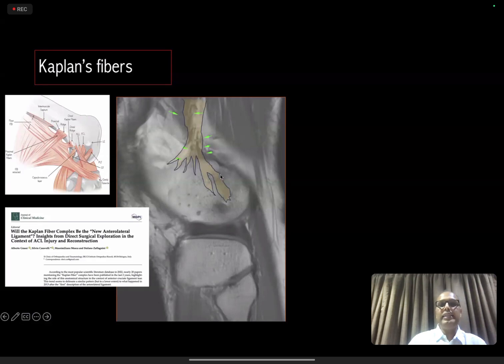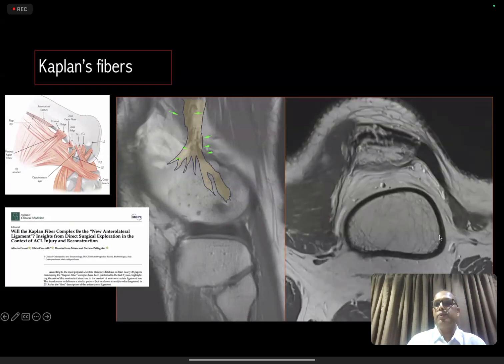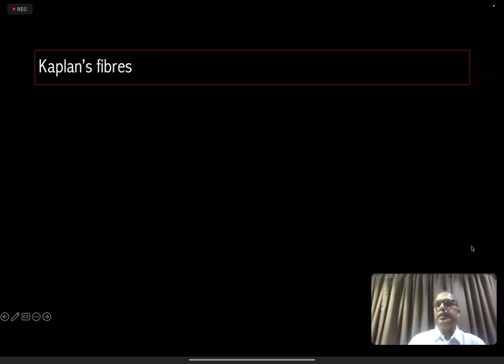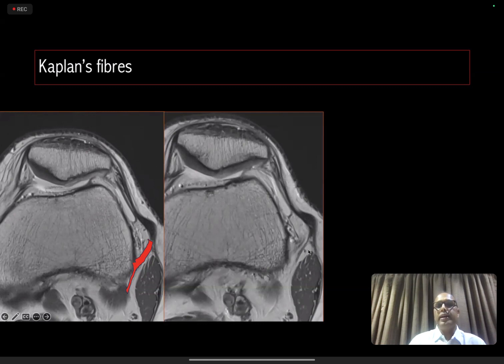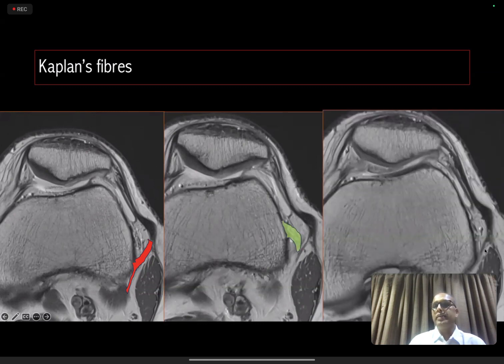They are seen in axial planes also quite well. We can appreciate those fibers going laterally. They merge with the capsule and the peripheries of the superior aspects of the retinacular bands. So those usually would be appreciated better on the axial planes. These are the vertically oriented fibers. These are obliquely oriented fibers. They are quite randomly oriented, but their aim is to hold the capsule with the bone, or rather, I guess they are part of those condensations of the capsule only.